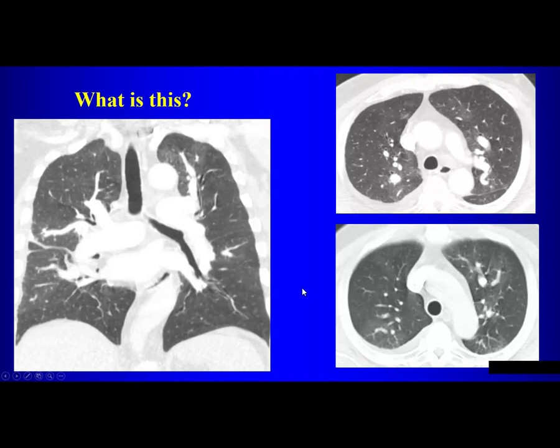Okay? So what's different about the blood vessels when you do that? They're bigger in the regions of higher attenuation. Yeah, now remember we said there is mosaic attenuation, but there was a more specific term to use in this particular case when the blood vessels are smaller in the lucent regions. What was that more specific term? Mosaic perfusion, right. So here we have mosaic perfusion. You see the blood vessels are smaller within the areas of lung of low perfusion. It almost looks ground glass here compared to these areas.